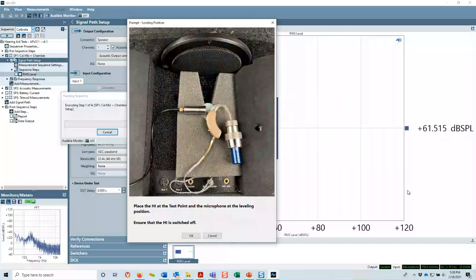So what the system is going to do now is regulate the speaker to a sound pressure level of 80 dB SPL. Then I'm going to measure the frequency response of the loudspeaker without any EQ, as shown here. I'm then going to invert that EQ, invert that curve and apply it as an EQ, and I end up with the leveled response of the loudspeaker.